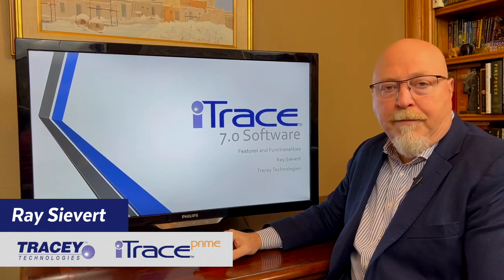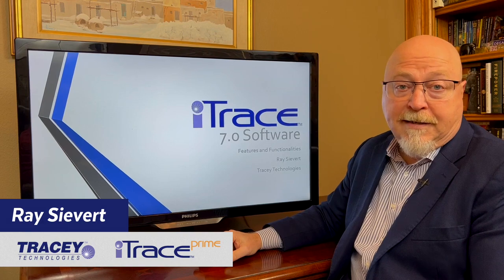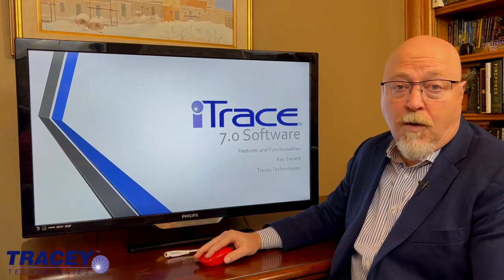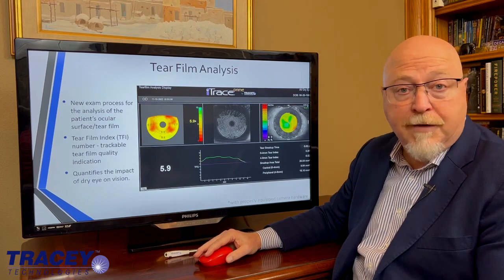Hi, Ray Sievert here today to talk about version 7 iTrace software. It's exciting, a lot of interesting things to know about. Let's take a look. This is a summary and an overview of what's in version 7 software.